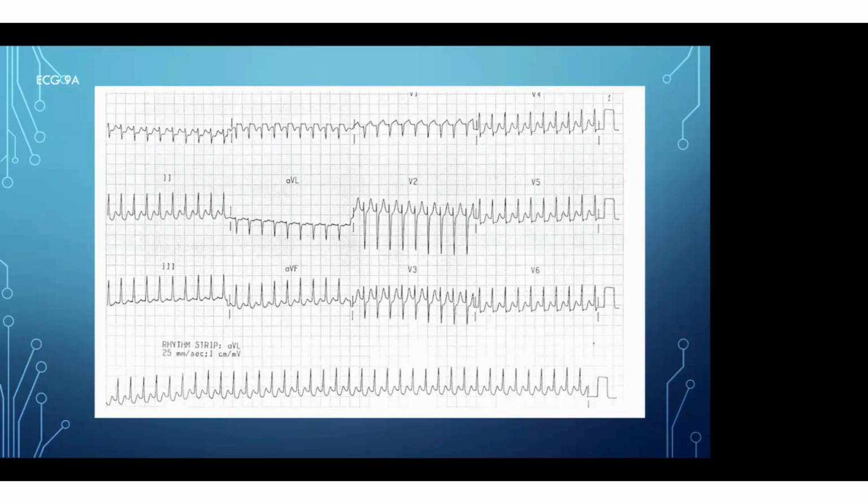We will understand a little bit of the mechanisms. This ECG can be AVNRT, AVRT, all those things. It generally comes as SVT, and it's a narrow complex tachycardia, which is very well tolerated by the patient. The only symptom is the tachycardia. There will be no warning signs with a patient with SVT, like pulmonary edema.